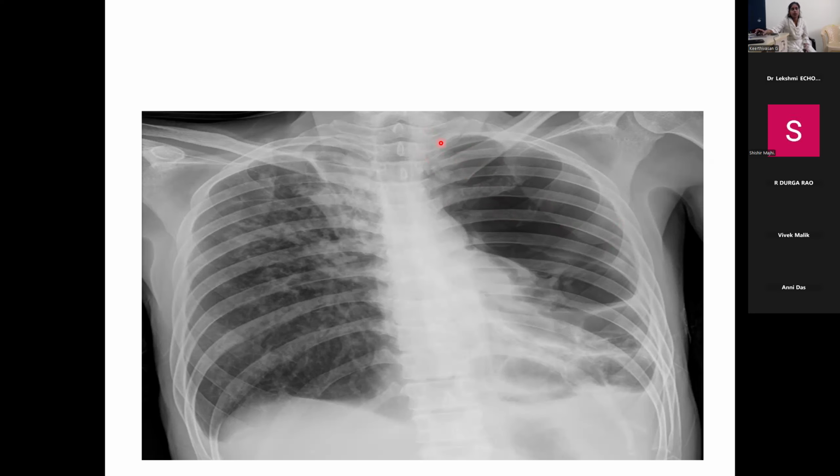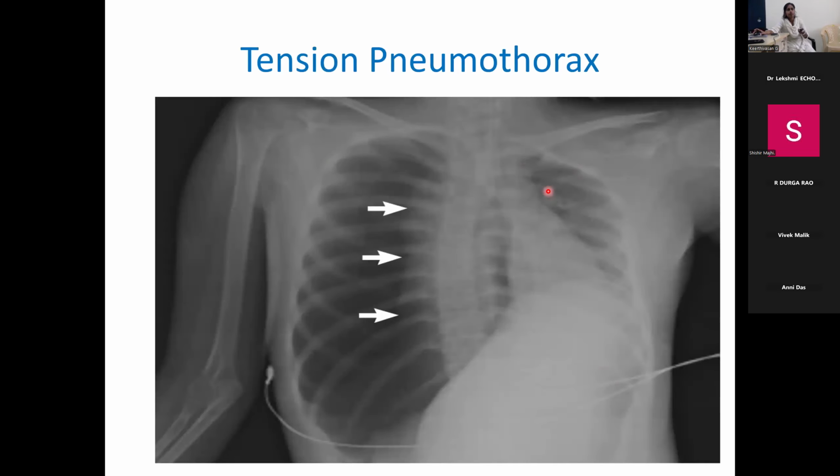Apart from that, there is a pull of the trachea here, and there is a lot of cavitation. This is nothing but a very big cavity sitting in the left upper zone and middle zone. So this is not a pneumothorax. You always have to trace the collapsed lung border in a case of pneumothorax. Plus, what will help you? Your clinical findings.